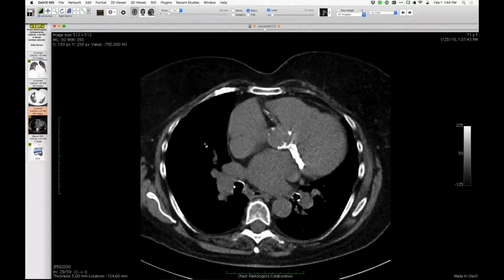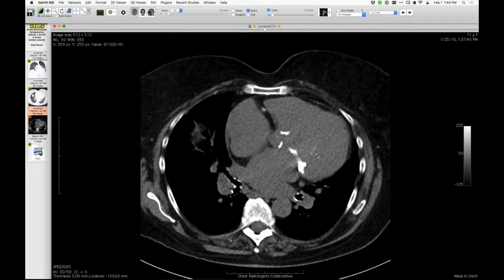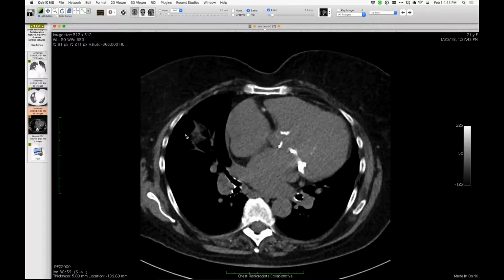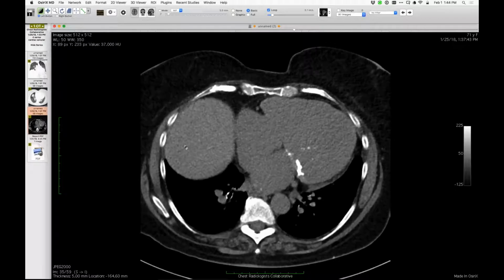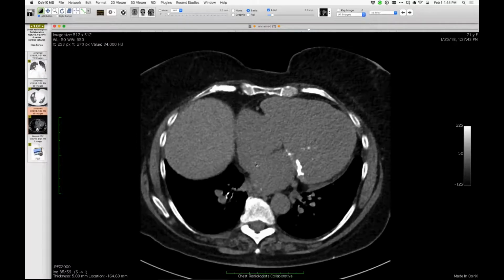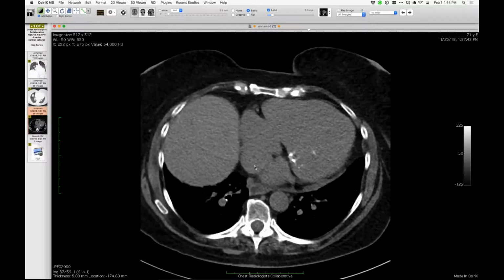And then when I scrolled down, at some point I said, oh wait, there's more than just the annulus, because there's some that project right there as well. So let me show you that. And then we go a little bit further down and we see more of them. And sure enough, I read the ultrasound report, and they described calcifications as quite large in the mitral valve leaflets themselves. So this is calcification in the leaflets.